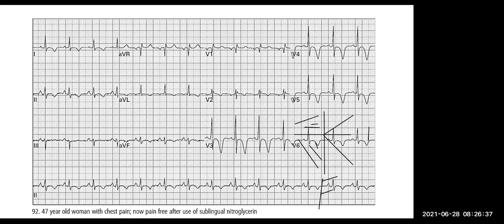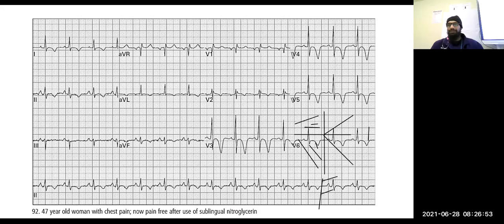All right, and then let's look at lead AVF. So which way is lead AVF pointing? Up or down? Or up and down? Neither up nor down, isn't it? Biphasic, correct? So let me just put this on the video panel as well. When we say biphasic, if we look at this one here, look at where lead AVF stands. It's right at the bottom.